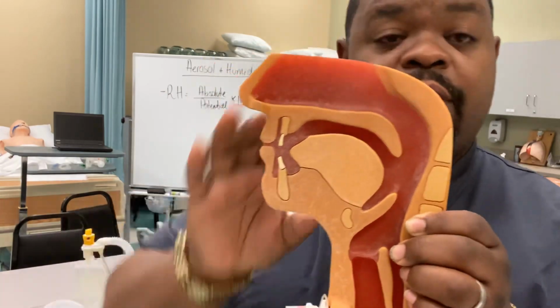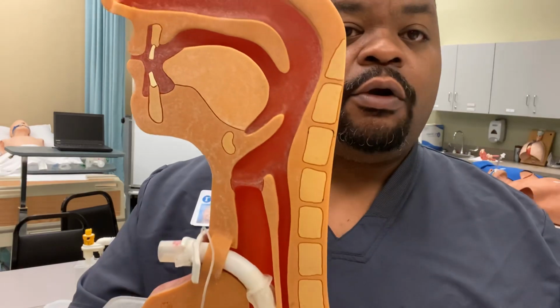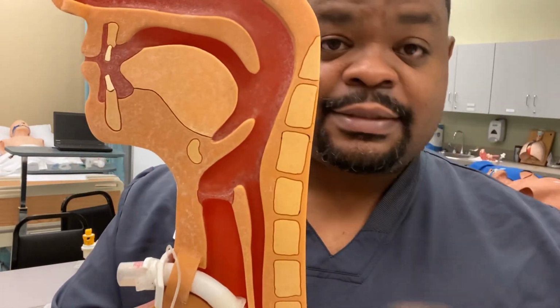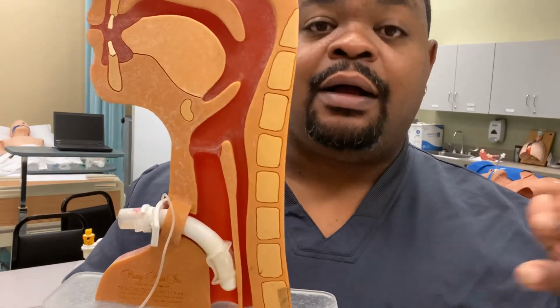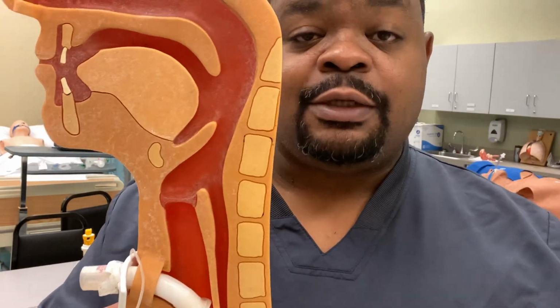because he's not breathing through here, okay? So if I am a respiratory therapist and I have a patient with an artificial airway or his upper airway has been bypassed, I must heat and I must humidify that gas, okay? If not, I'm going to dry everything out from this point on. Trachea, bronchus, bronchi, bronchioles, terminal bronchioles, respiratory bronchioles, right? Everything is going to become dry, right? The patient's lungs will become dehydrated, and in your lesson, we learned the domino effect of inadequate humidity.